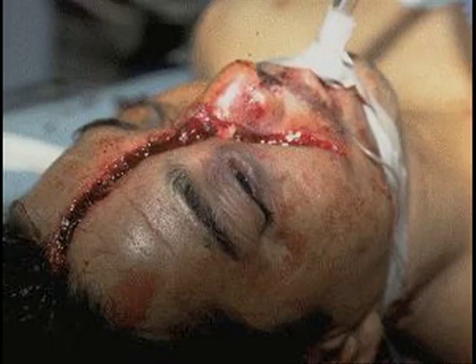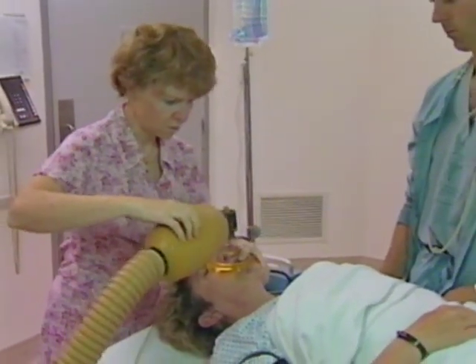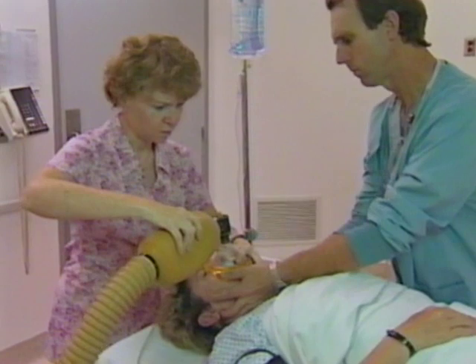Trauma patients may be particularly challenging because parts of the face may be injured or even missing. Foreign bodies, such as broken teeth, may be present and need to be removed, and there may be bleeding. This makes it hard both to apply effective pressure to maintain a mask seal, as well as to keep the airway clear of secretions. The help of an assistant in any of these situations can be highly effective.